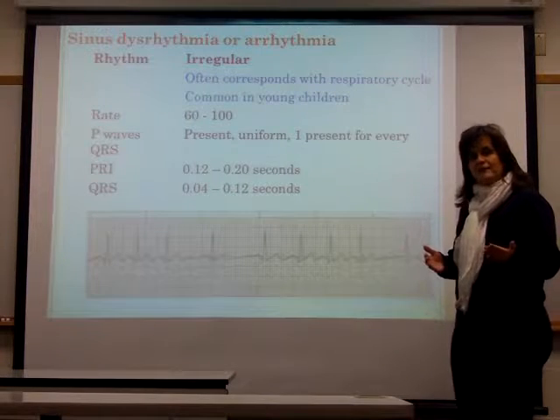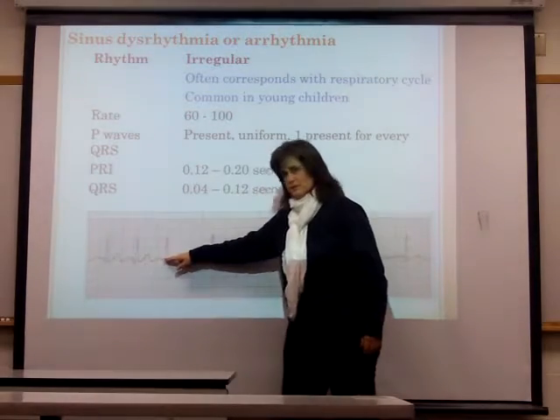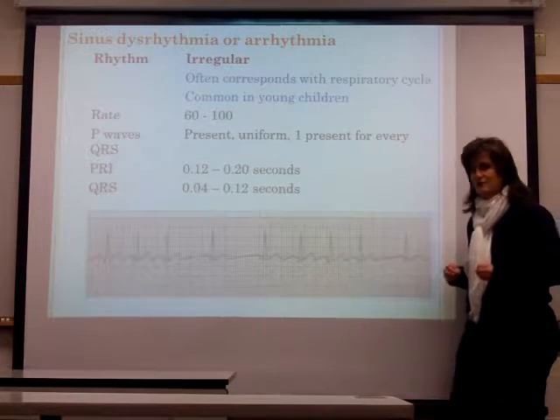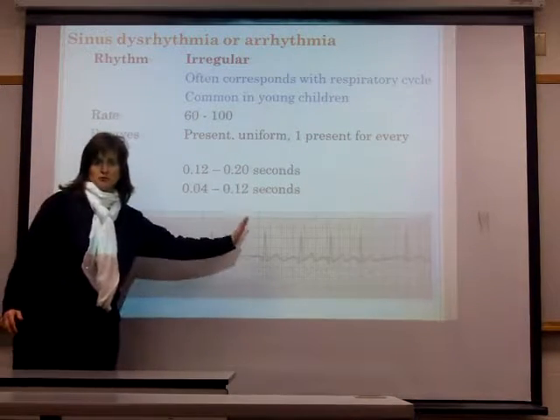If you look back at it from a distance like you are right now, you can clearly see how it is a little bit faster here, and then this segment slows down, and then it goes back to being a little bit faster here. That's the classic pattern of sinus dysrhythmia. So again, that's one of the major reasons why you start from the left and move towards the right.